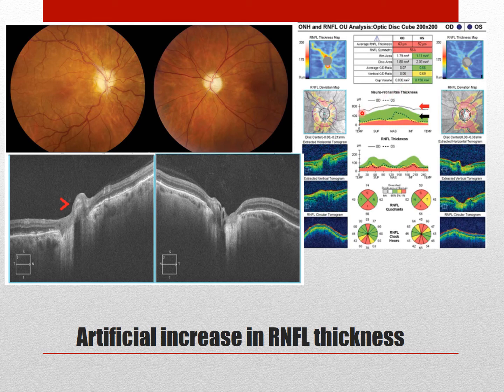It's really tiny, so you see lots of neuroretinal rim, compared to the left eye, where you see more in the normal range in the inferior nasal part, around here, compared to the rest, which is very thin. So that's what's happening there.